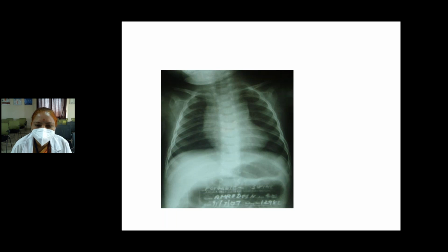Pavan. Right side cardiac borders are extended, ma'am. Right side atrial enlargement is there. Okay, I will agree, right atrium. Usually it should be less than 2 spaces here. 1, 2, 3, 4 spaces. So right atrial enlargement is there.